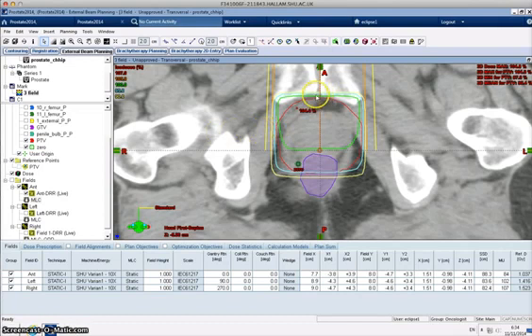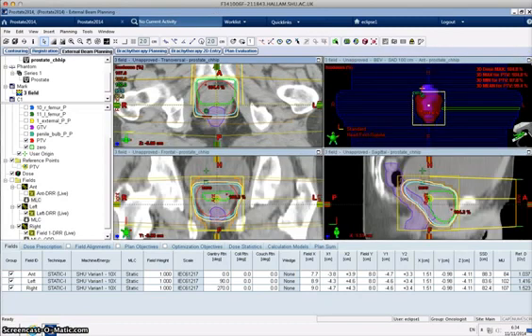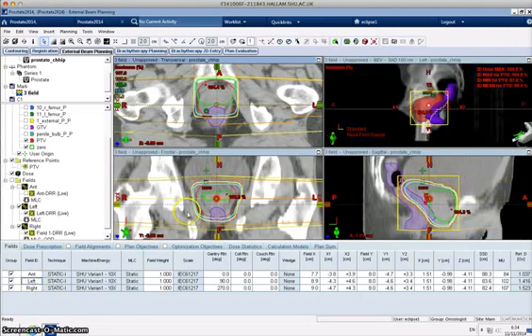It's a little bit baggy here, so again we could pick up one of the lateral fields, left or right, would both do the same thing, or what we would probably do is move them both a tiny bit. So we want to move the field size smaller in this region here. So if we go back to our beam's eye view, pick a left field, and we know that that's anterior, so we can see our little man there, and we can see the anatomy up there to tell us that's ant, and the big A as well.